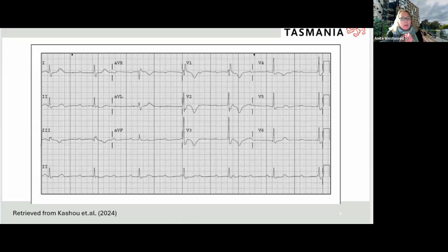They are atrially driven, but they're not getting through. In other words, the P wave does not cause the QRS complex. The QRSs are occurring in their own rhythm, and they are regular. You'd have to pace them out, but they look regular to me, which means that it's a regular ventricularly driven rhythm. The only output this patient would have would be bradycardic.